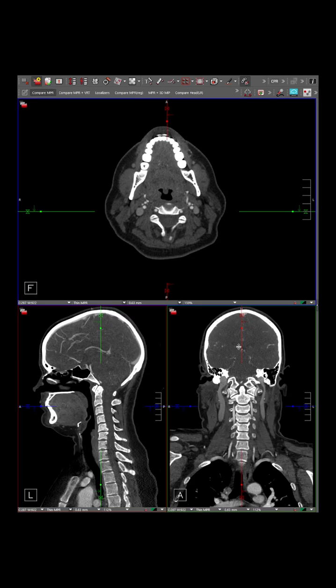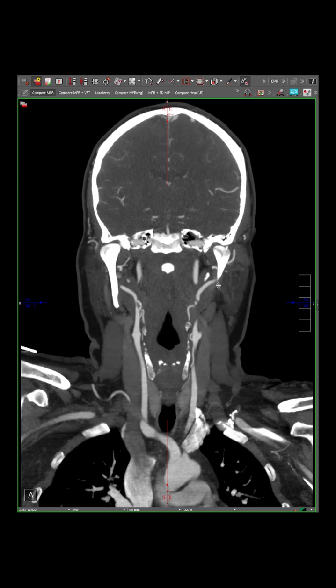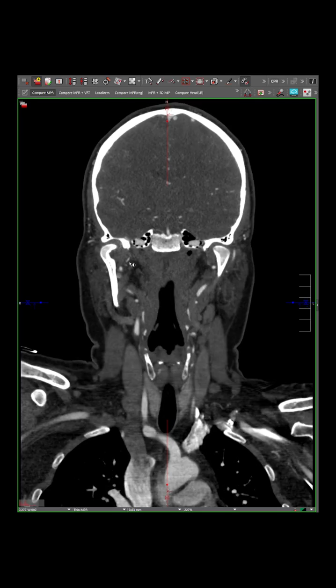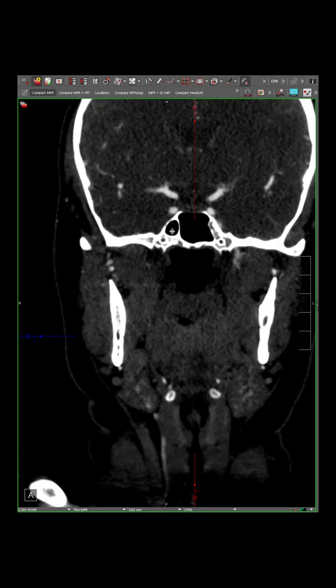But in an MPR viewer, right? Let's just say you're looking and you want a MIP. You just create that MIP, right? And then as you approach the skull base and you're looking at something where the anatomy is a little bit more fine and complex, you can bring it down again, and follow, say, the carotid through its petrous portion and into the skull base.